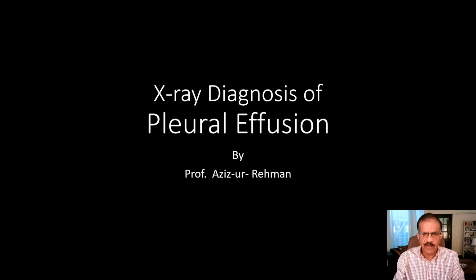Professor Aziz-ur-Rehman again, and after a detailed discussion on normal X-ray chest, we are going to take up various abnormalities, and today we're going to talk about pleural effusion. Pleural effusion is a fairly common condition, and in the examination you will be expected to diagnose pleural effusion, and then based on the pattern you will be asked about the etiology. It is possible actually to determine at least fairly accurately the etiology of pleural effusion on X-ray chest.